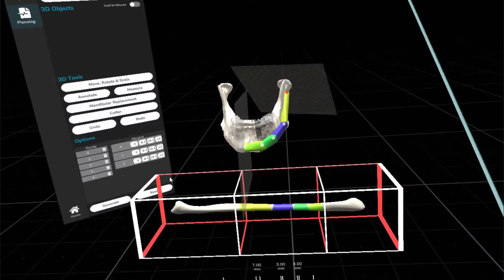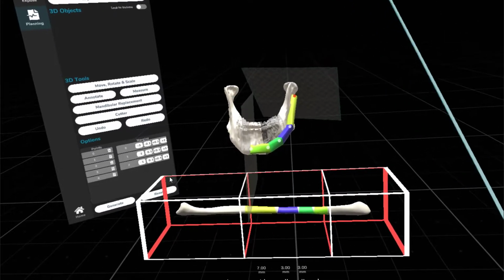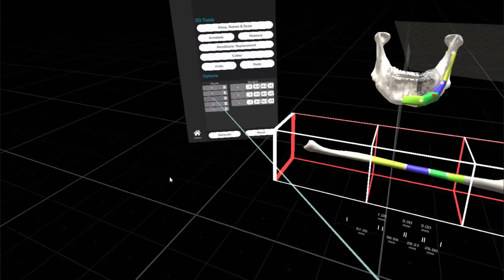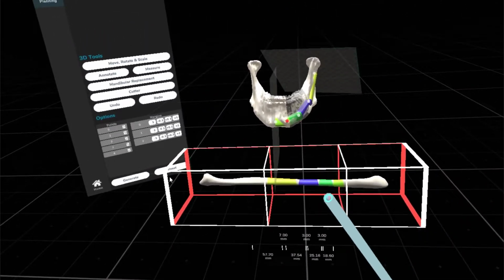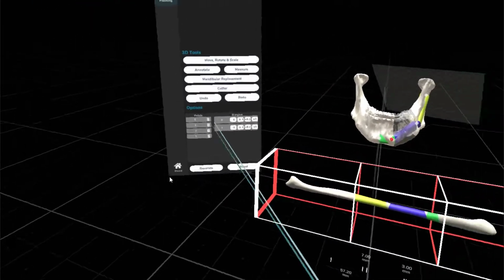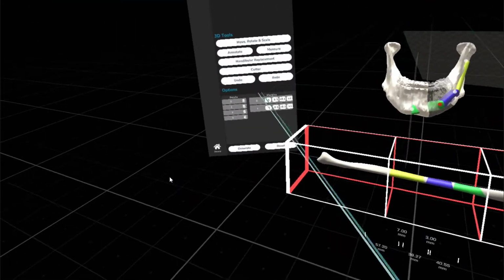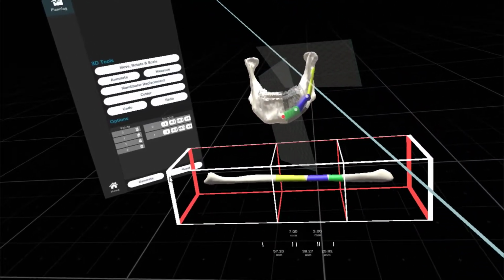We'll go ahead and maybe move it down a bit, and we'll rotate the plane, just so it's however you feel comfortable, and probably push it in a little bit. And we'll do the same for all those points. We'll push them in a little bit. Now, of course, say if you decided I don't want one of these points in here, you can just remove them, like so. And then we can maybe go ahead and manipulate the points back, just so we've got a bit of a different representation, and we'll change that cutting plane to suit.